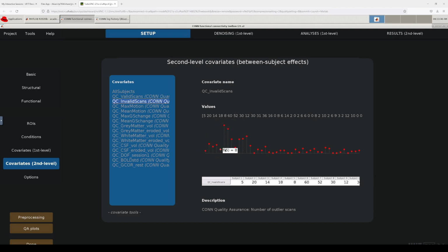And what this shows is there is this one person, subject number 6, who had what was called invalid scans, meaning that they had too much motion on those relative to the kind of the baseline. For the most part, people were pretty low. This is a clean data set. There are a few who had more motion, and what happens is those get motion corrected, or they can even get removed from the analysis. In some cases, these are outliers, and which can be okay.